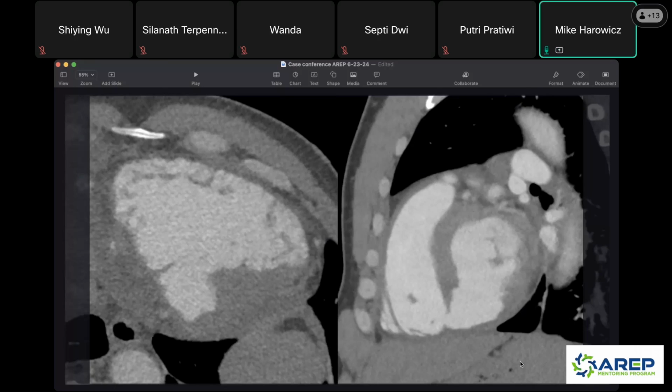So as I said, when I was talking about the left ventricle, when we get sort of this sagittal or short axis view, I think of the left ventricle as a donut, right? Thick walled, but the wall should go all the way around exactly like a donut is. Well, to me, there's a loss of that donut down here. It looks like somebody took a big bite out of it, right? So there's a big area here that looks like it's now communicating with the right ventricle, right? This should go all the way around and it doesn't.